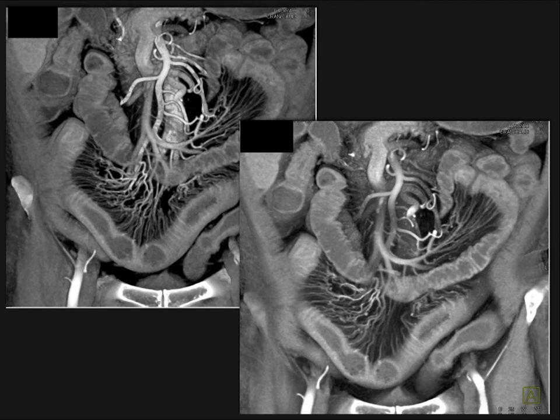And then when you take those same images, you do MIP imaging, look how nicely we see the vasa recta, the multiple small vessels, the abnormal bowel, beautifully shown with the MIP imaging. And then when you switch to volume rendering, you see the vasa recta, but also the enhancement and thickening of the patient's small bowel. And as I've mentioned before, the volume is everything. When you look at only the vessel and you're looking at axials and the vessels being partial averaged, it's very hard to get a good understanding of all the pathology. And so within the volume is significantly more information.